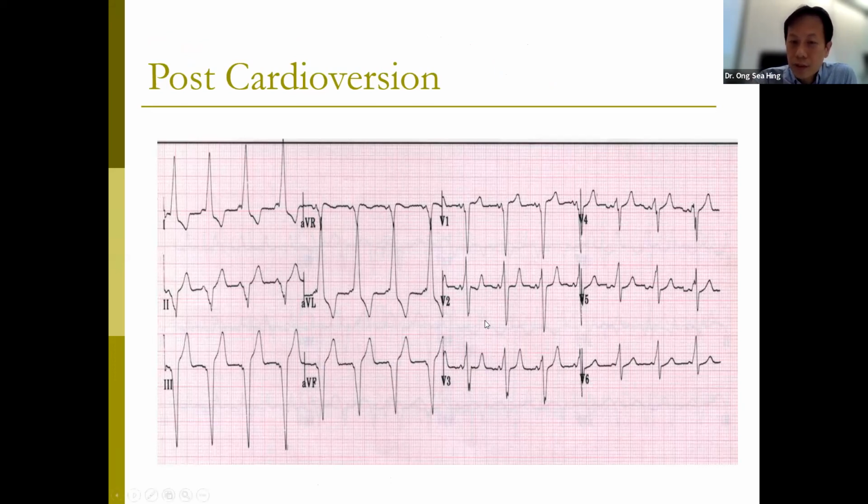Most of us will also recognize this ECG. Those of you who are a bit more senior will recognize this ECG. This is an ECG in sinus rhythm. If you look at the P wave, there's a P wave, and then there's a QRS complex. And if you look at the beginning of the R wave here, you will see what we call a delta wave, or pre-excitation.